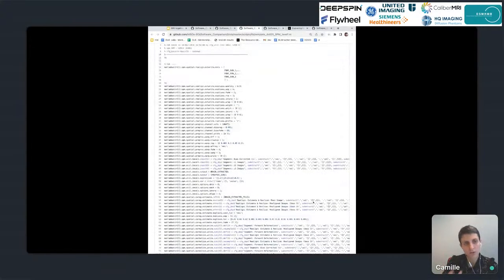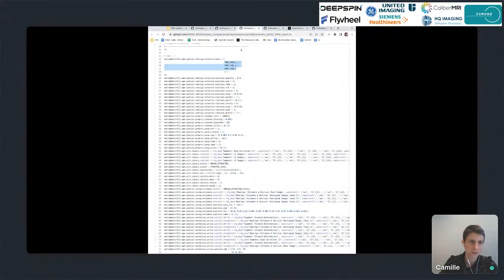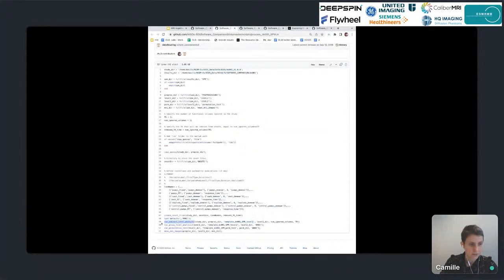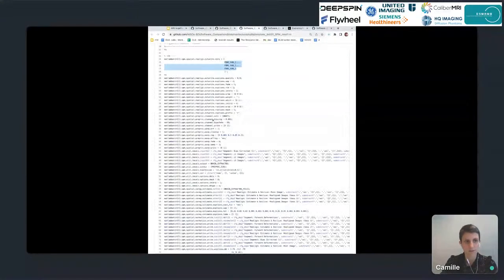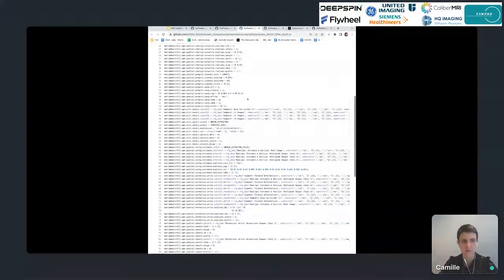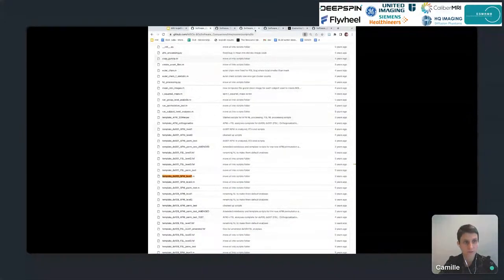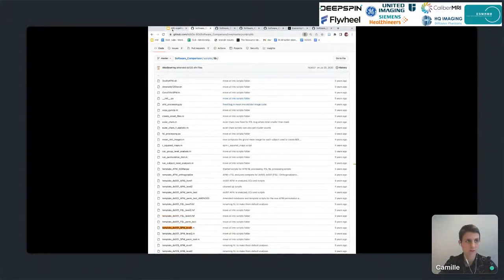So basically, all the code in that repository is based on the idea that we have a template for the MATLAB batch for SPM, or the FSF files for FSL, and, I guess, AFNI proc for AFNI. And then we have placeholders to replace with the actual data. And then the script we were looking at earlier, when it runs the run level analysis, is going to fill in the right data for that particular subject and then apply the MATLAB batch for SPM, the FSF for FSL, or the AFNI proc for AFNI, and run the full analysis. And once you've done that, you can reproduce the figures.